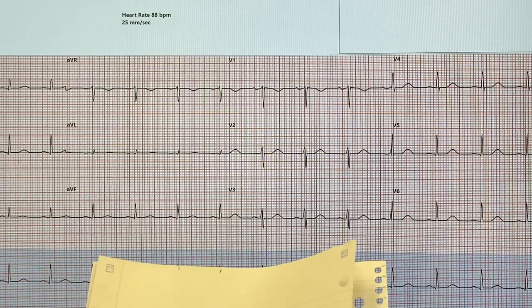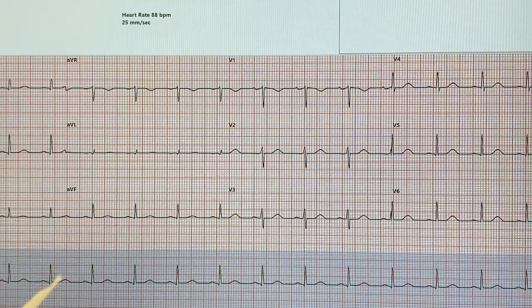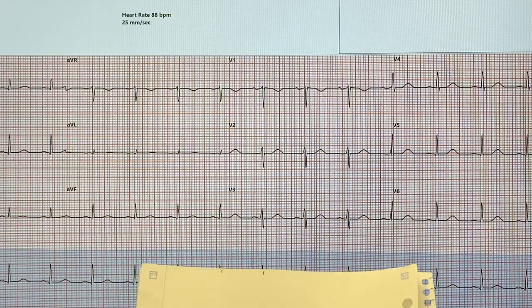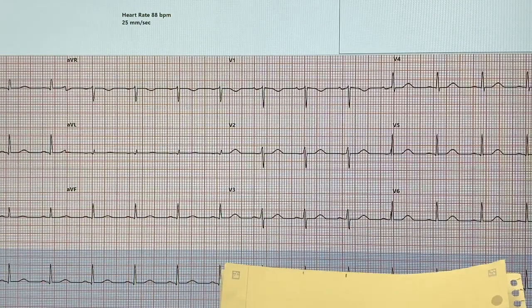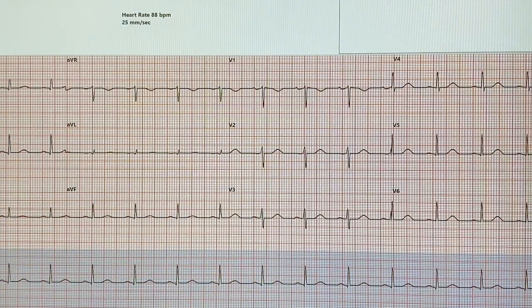So in an EKG class, we use a caliper, okay? Those little things inside of paper. But, you know, you don't need to be that fancy. This serves the same purpose, right? So you march it out if you're visual. If you want to count, by all means, you can count, right? You can count how many either big squares or small squares are here, and then count the same for each one to see if they're regular, if they're all the same. Then if that's the case, you know, okay, the rhythm is regular, right?